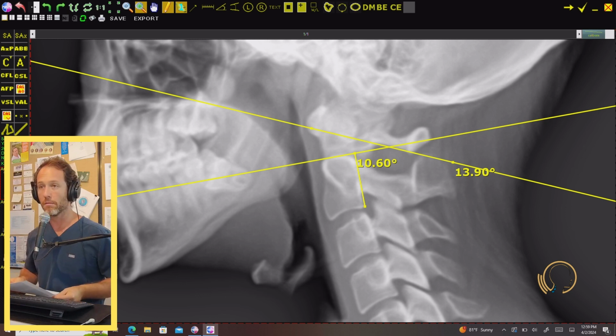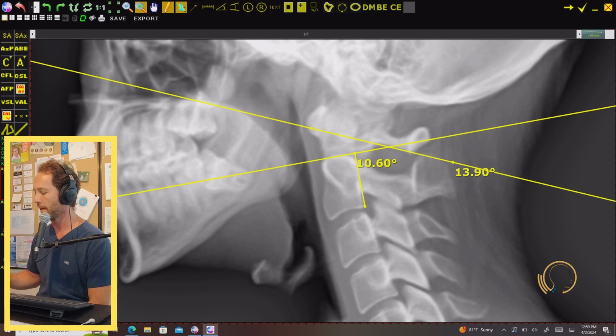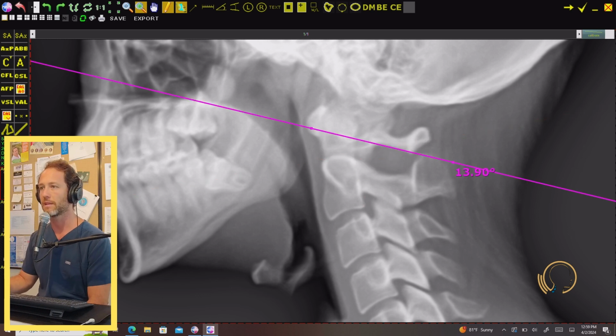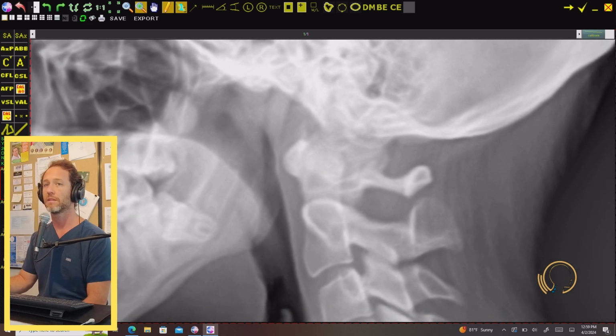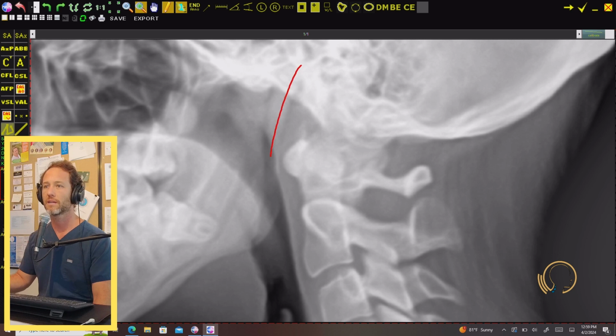All right, moving on. Locating the transverse process. Now, I know it can seem like maybe if this is not how you practice, this is too much detail, but I'm telling you, this one is important too. This is huge. Just like that height on your Z is really important, making sure you're aiming the instrument at the thing you're supposed to be aiming the instrument at is huge. So let's just give you a few references and talk about, again, why this is relevant.